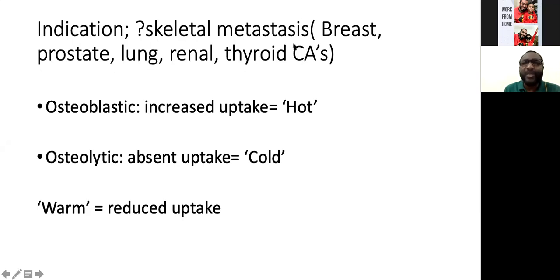But it's also important to note that even those malignancies that metastasize to the skeleton have a preferential area in the skeleton that they go to, and they have a pattern, like osteoblastic and osteolytic. Breast cancer, for instance, is mainly mixed osteoblastic and osteolytic, and it has a preference for the axial skeleton. Prostate cancer is usually purely osteoblastic. It can involve the entire skeleton, but usually prefers the axial skeleton.